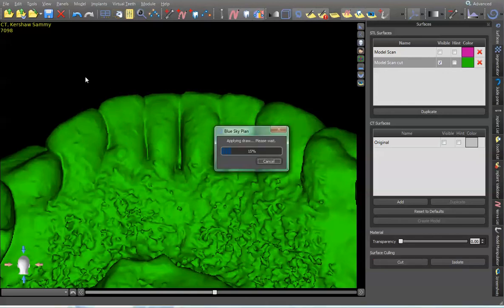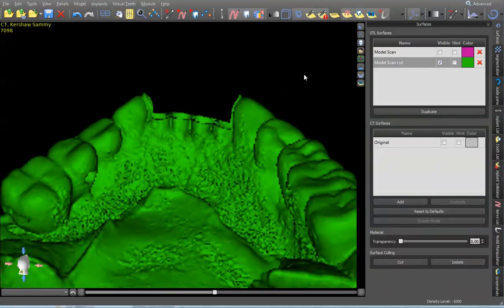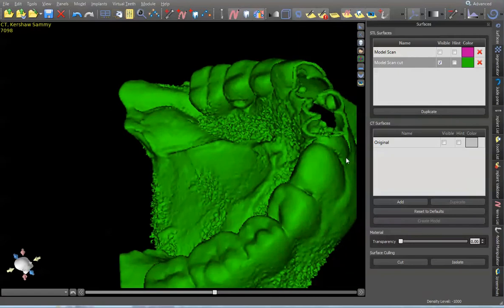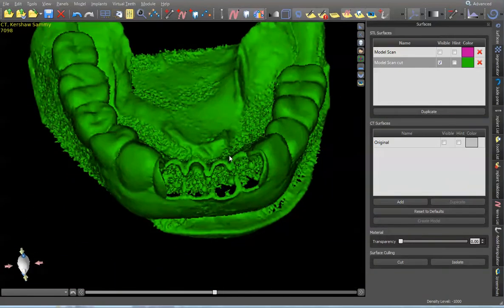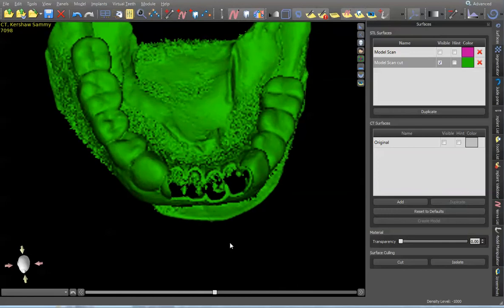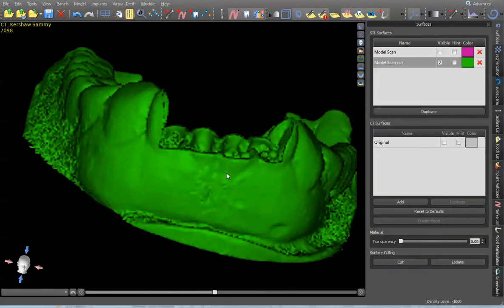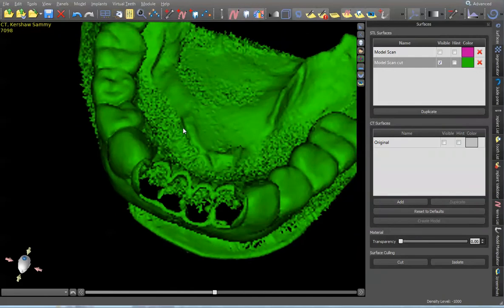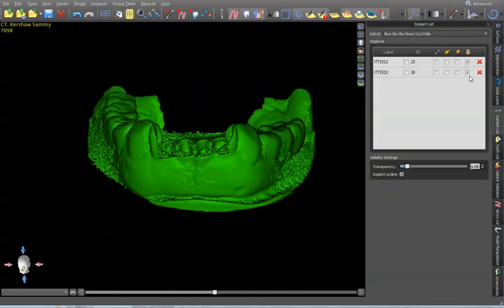That's it. That's pretty much how it looks. Like that. All right. It didn't say invalid mesh, although it does look like that. We'll see if we can work up our surgical guides. We'll turn the guide tubes back on.